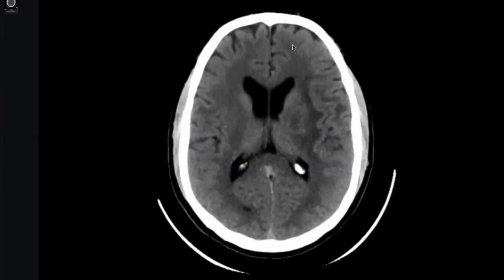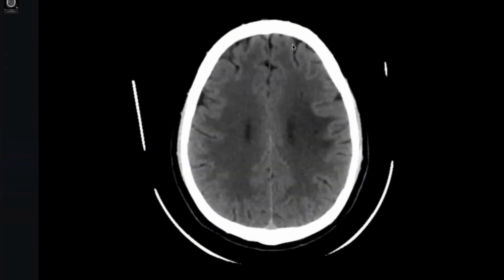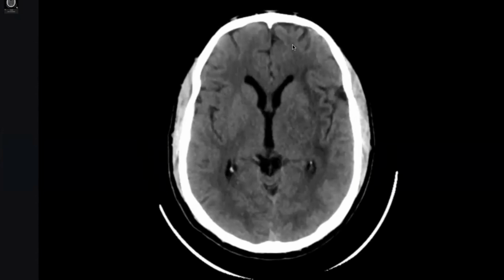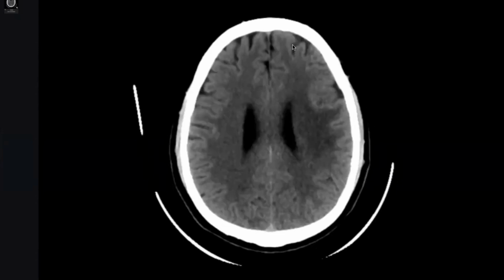It can represent herpes encephalitis or any abscess formation with marked brain parenchymal edema. Doctor, what is the type of this edema? This is vasogenic edema. Excellent. So it can be any intra-axial mass or abscess formation. Further, I will go for MRI brain with contrast for further characterization.